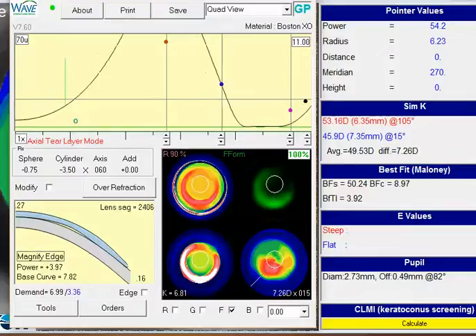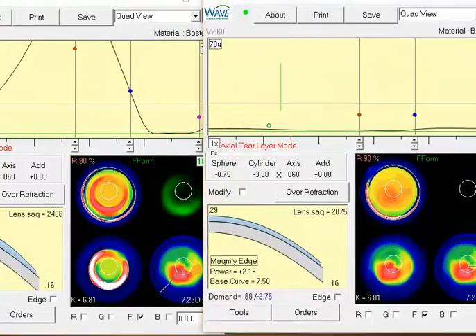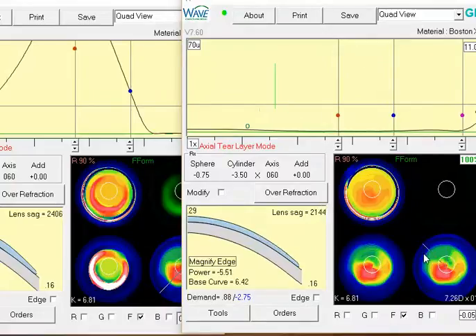And you'll see I pulled up a little design where I did that. And if we kind of compare it to yours, you'll notice that I just put a little aspheric design to redesign the lens, and you'll notice that now you have that back surface of the lens matching the cornea very closely. And if you go around basically the clock dials here, you'll see again very nice alignment in that blue to pink landing zone. So this should help this lens align much more nicely.